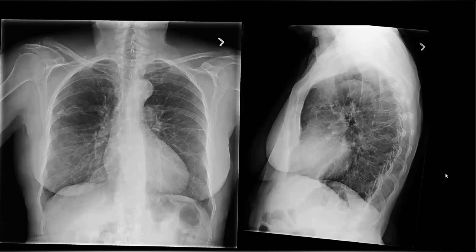Considering it to be a female, I'm suspecting the patient might have some cystic lung disease, for which I would go for CT images to confirm my findings. Any differentials? Considering a female, my first provisional diagnosis is LAM.